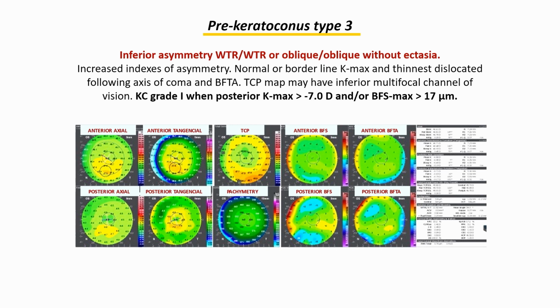Canelopoulos produced a lot of cross-linking in cases that he believes are keratoconus, but I told him once, maybe they are not keratoconus because you didn't see the posterior surface. You are only observing the anterior curvature map, and in this we have a very clear asymmetry, anterior and posterior. But you can see completely green here in the best fit sphere and best fit toric and spheric maps. So there is no ectasia, and the pachymetry is very good.